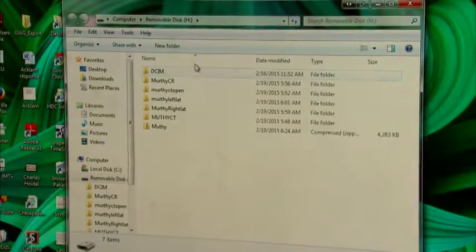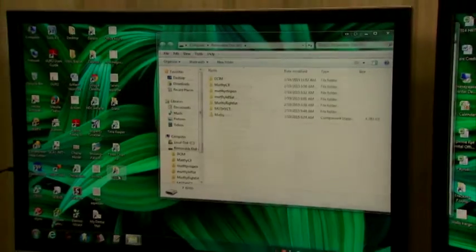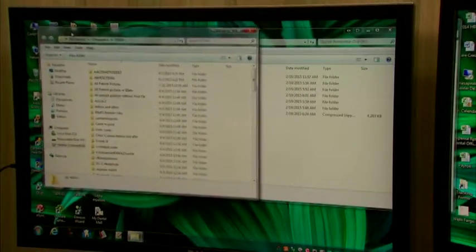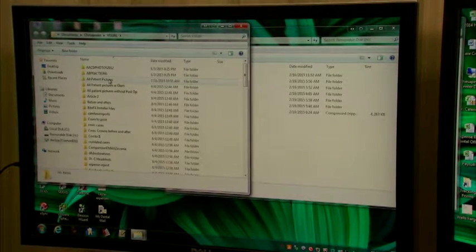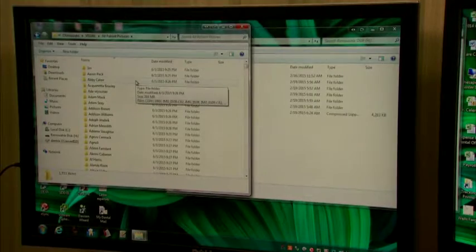So if you can have your IT guy make you a little file, and notice that on our computer, on our desktop there, we have a file there called Visual that's basically a shortcut to all the places that we store pictures. So on the third one there, we have a file called All Patient Photos. Now let's go ahead and show how we would create a file.